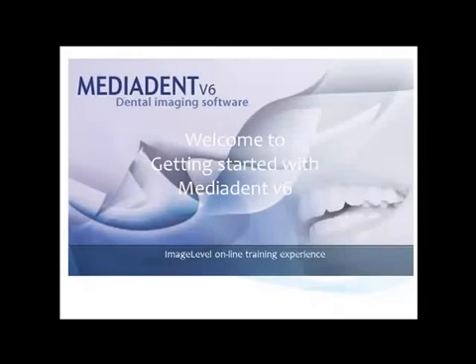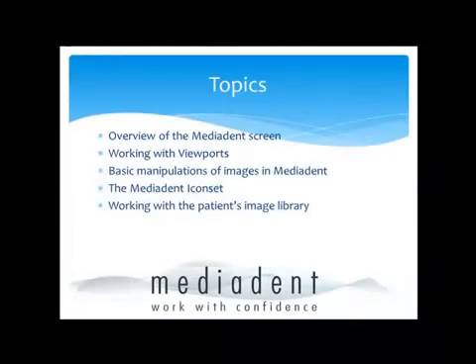Welcome to the Getting Started training session. This is the second training session you can follow. The first training session was the overview of the MediaDent screen. Now in this short demonstration we will focus on working with the viewports.